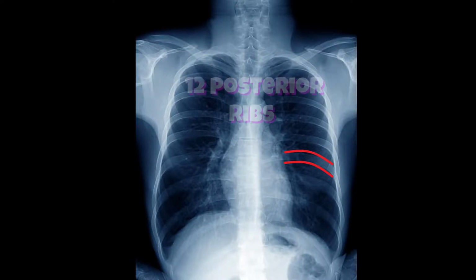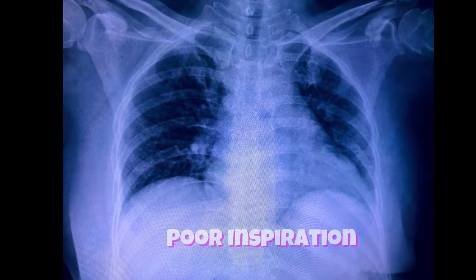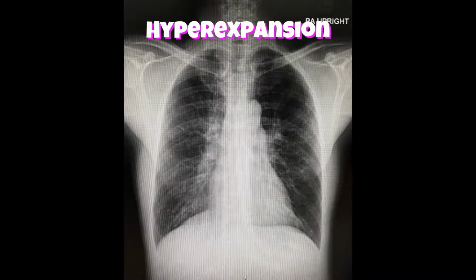It is important to highlight if the chest x-ray is showing a poor inspiration because it may not be able to show up significant structures. Equally, it's important to identify if there is a hyperexpanded film. A hyperexpanded film demonstrates a large thoracic cavity, and this is often found in COPD patients where they often have flattened diaphragms or a barrel-shaped chest. In this situation, it's very important to recognize that this is a hyperexpanded film.